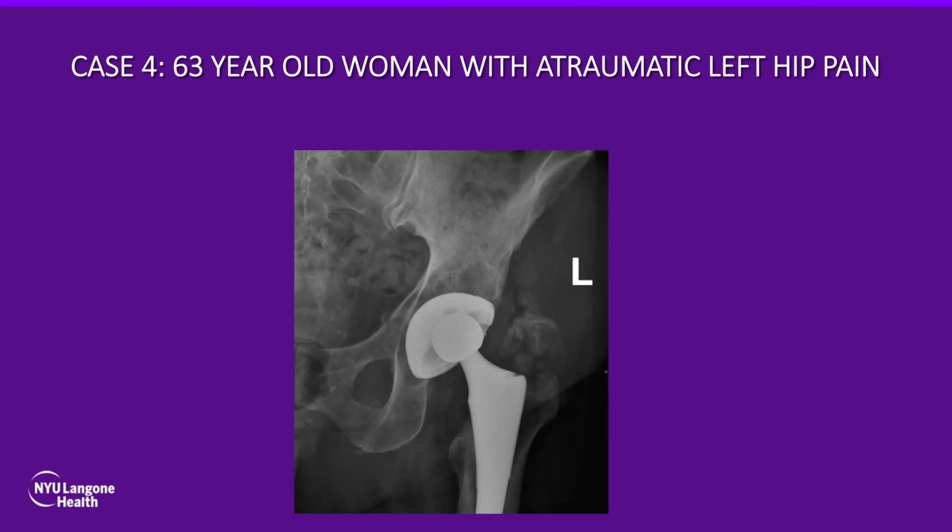Then I look at the bony structures. I see this lobulated area of bone loss here, right? You see this bone loss or so-called osteolysis. So I have osteolysis plus liner wear. Putting these together, that's a good finding for particle disease.